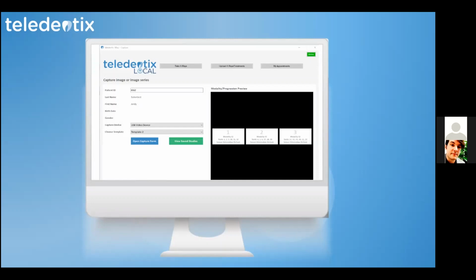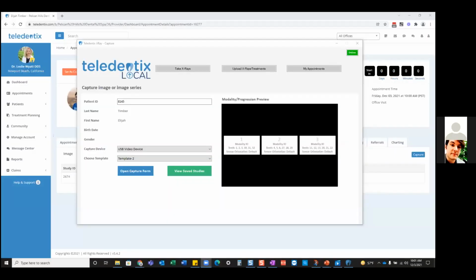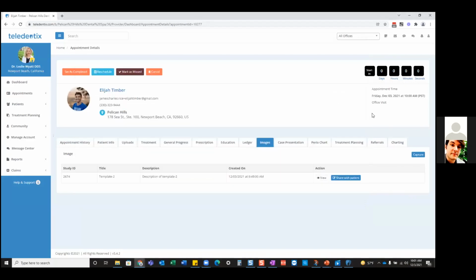All right, let me go ahead and stop this share here, and I'm going to go into my next screen, which is going to take me right back into Teledentix. So let me go ahead and select this here, and I'm going to share. All right. Okay, so now that I'm here, let's just say I'm going to go out into the field today. I want to make sure that I'm prepared. I have everything good to go.